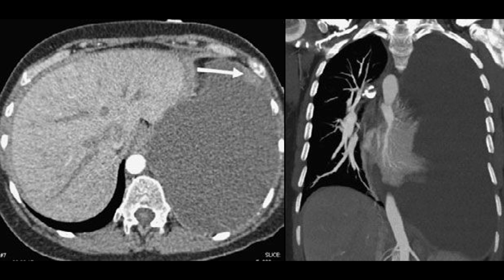The key teaching point here is that a large effusion can act physiologically like a tension pneumothorax. The mass effect of the fluid compresses the contralateral lung and shifts the mediastinum, impairing venous return to the heart and potentially leading to cardiorespiratory compromise. The depression of the hemidiaphragm and contralateral shift of the mediastinum in this case indicate tension physiology. If the patient is hemodynamically unstable, this finding requires urgent drainage.